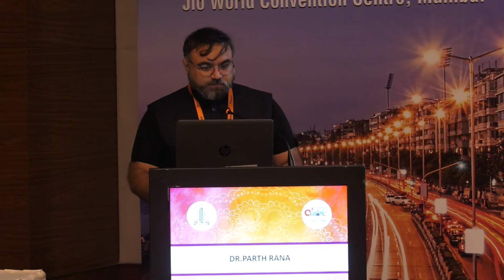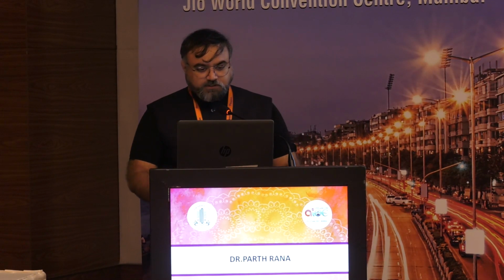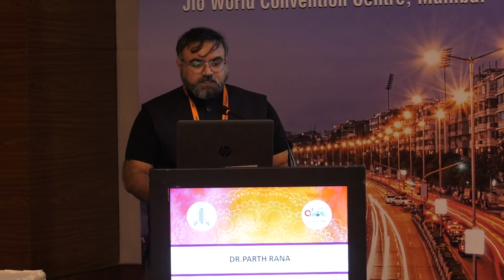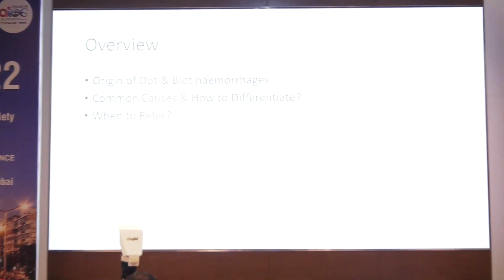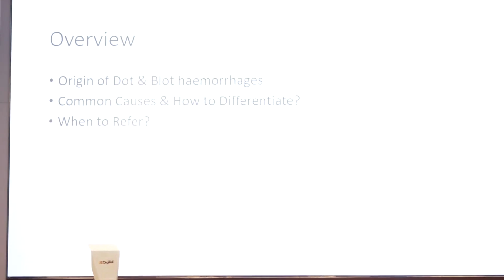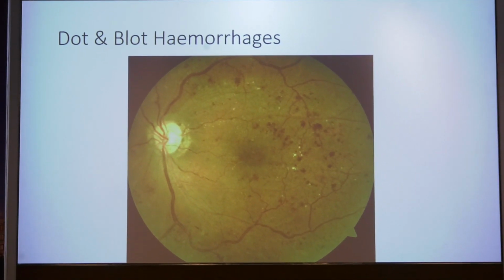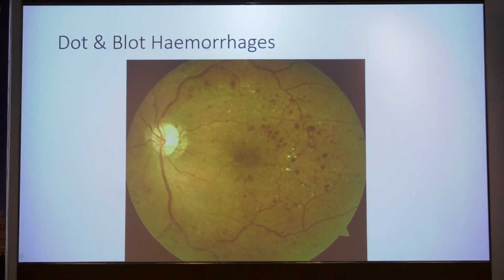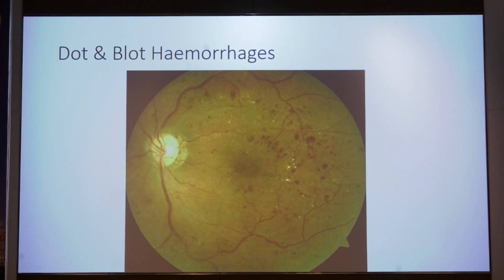So today I'm going to present on dot and blot hemorrhages. It's a very basic topic. My overview for the presentation is: origin of dot and blot hemorrhages, common causes and how to differentiate, and when to refer. This is a basic presentation for those who have just passed out from their post-graduation. These are how dot and blot hemorrhages look.